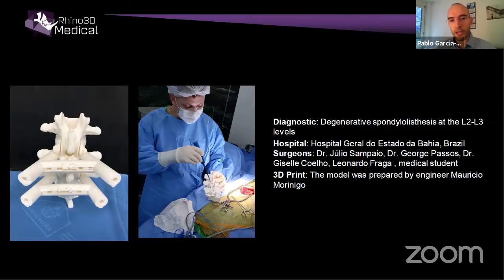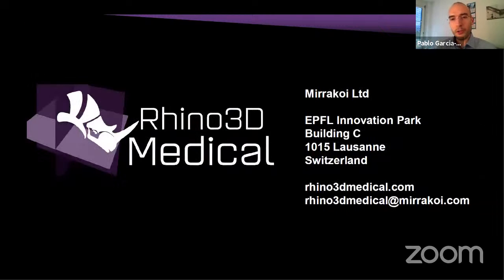So this is a bit the direction that hospitals and operations are heading now with technology. This blending of CAD software, 3D representations, VR, AR, and all these things is going to bring maybe a disruption in healthcare, and we are very happy to participate in it. So now I'm going to show you a bit of the software.